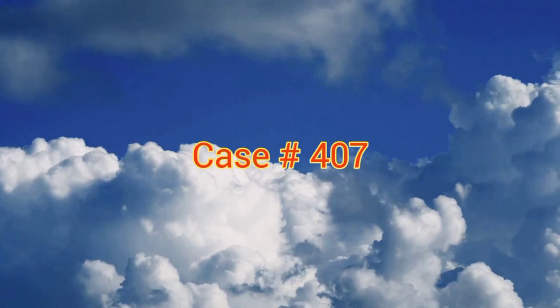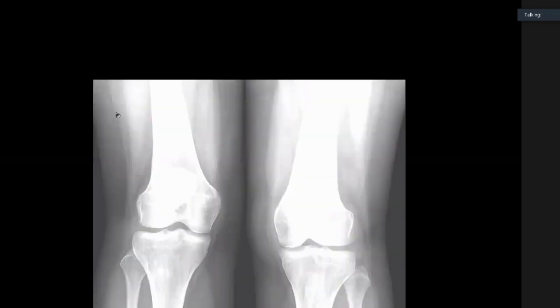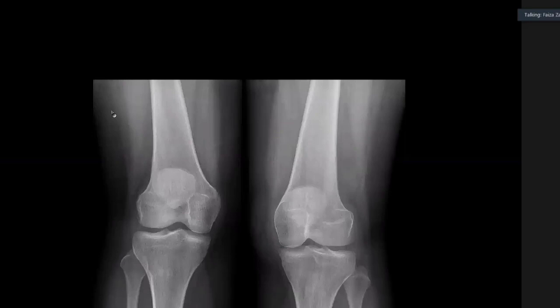Okay. So I've been provided with the frontal projection of both knee joints. Here I can appreciate that there are few... so bilateral knee joint pain. No, unilateral. Okay.